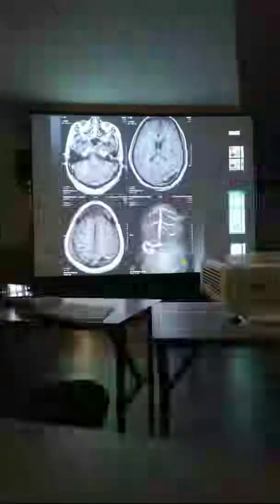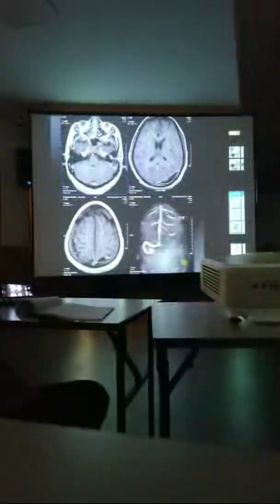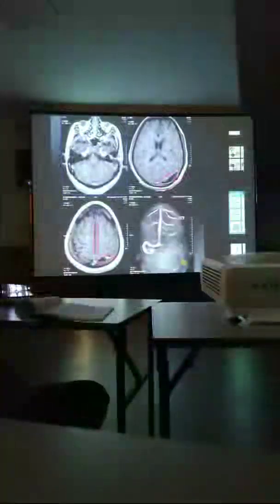This is a typical appearance. And here we can appreciate a semilunar shape. Subdural empyema, and you can see a subdural empyema will not cross the midline. It will go along the falx. This is the typical appearance of parafalcine subdural empyema. You can see the venous thrombosis also. The source is from the mastoid. You can see that as the source.